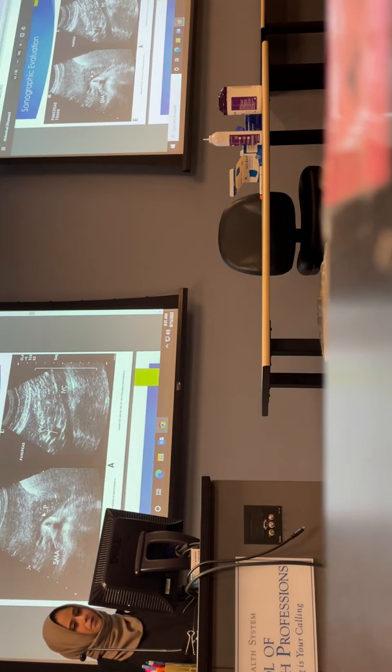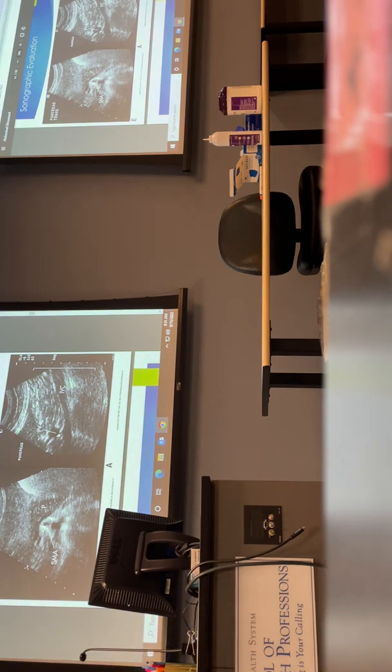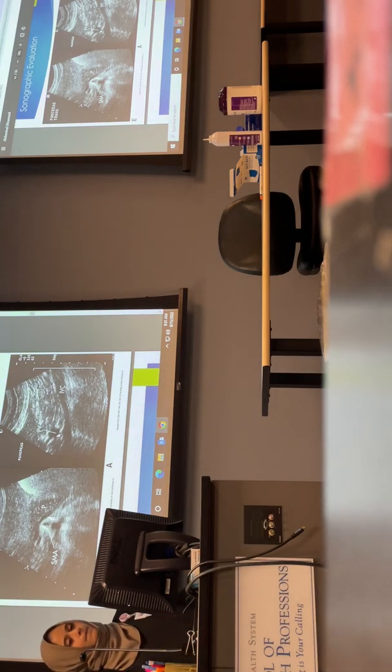These are just showing you different views of the same thing, so I'm not going to review them. But image B right here, or A it says, transverse or sagittal view. Look at the IVC. It's elongated, right? That should point you to the fact that this is a sagittal view, okay? Look at your aorta or IVC. Those are two structures that everybody at this point should know what they look like in transverse versus sagittal, okay?